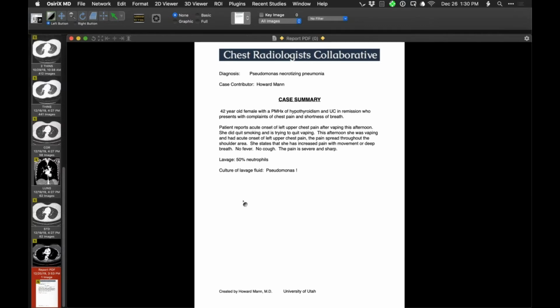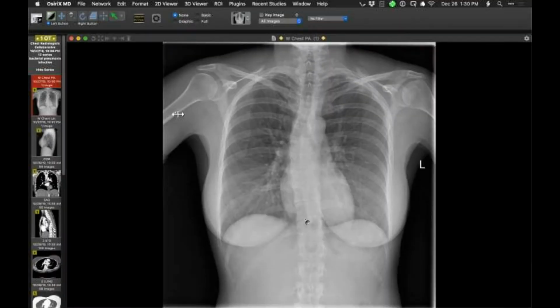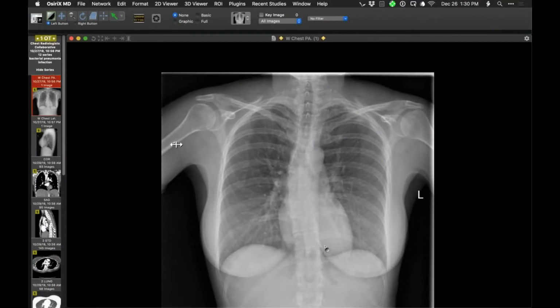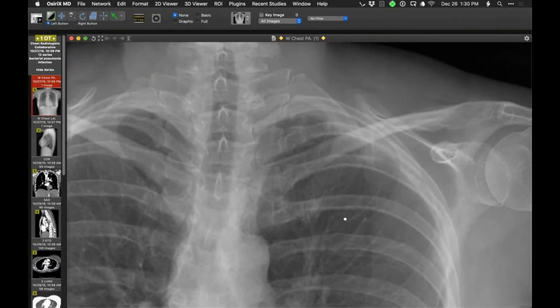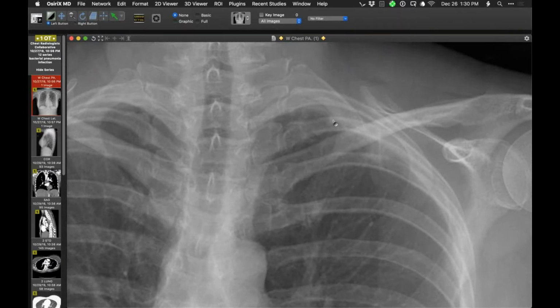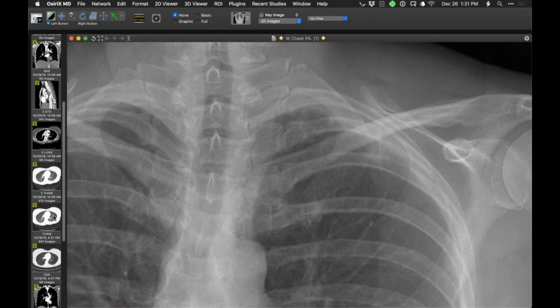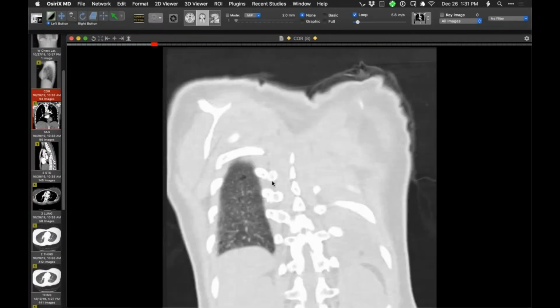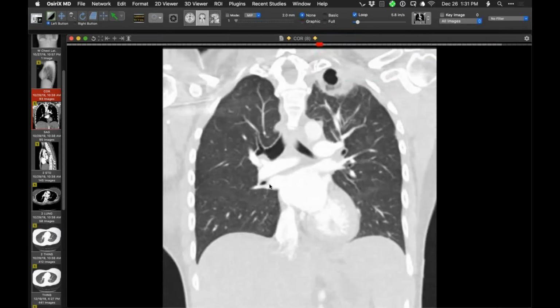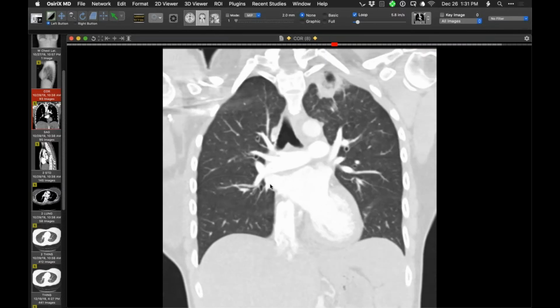Can you go back to the radiograph again? I want to look at that apex. Like you said, I didn't see anything, even in retrospect. It just looks like a little apical scar up there, like you typically see. Yeah, even at a stretch, it's hard to really see anything in there. I think your cursor was right over the hole in the cavity right there, but only in retrospect. Because that is not exactly a small thing. Right there, sorry. I'm impressed by that.